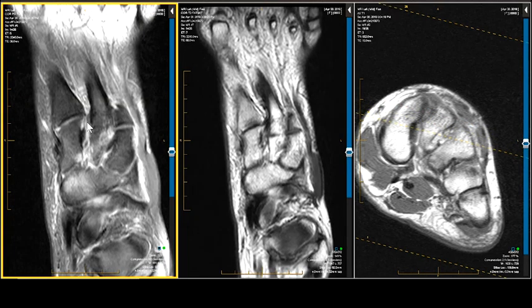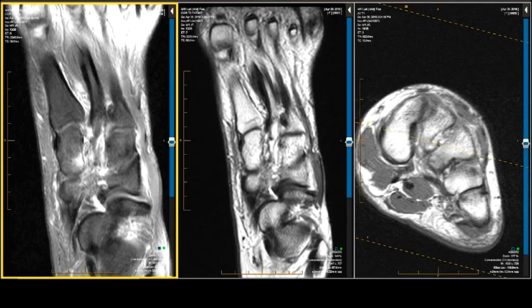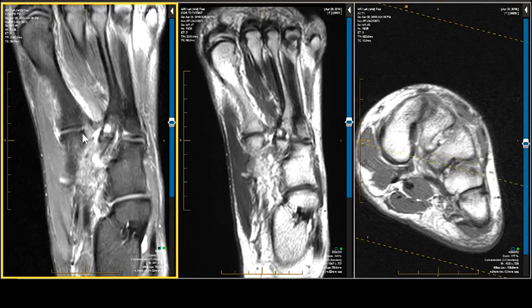The middle interosseous component, that's the most important. That's torn. Then the plantar components, we have a C1M2, that's torn. And we may sometimes have a C1M3. Well, if we did, we don't see it anymore. So that may be the last vestige of it right there. I don't know. But I don't see a C1M3 ligament.